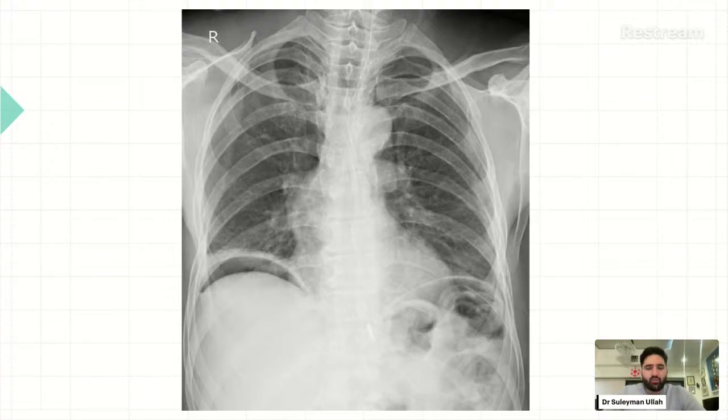Okay, and you might be thinking, why are we getting a chest X-ray for this patient? They've been diagnosed with appendicitis. Why are we getting a chest X-ray? Let me give you a bit more background. Let's say this patient couldn't get on the list for today, so they're booked for tomorrow's list for surgery. But they suddenly started complaining of severely increased abdominal pain. What are you worried about after seeing this chest X-ray?